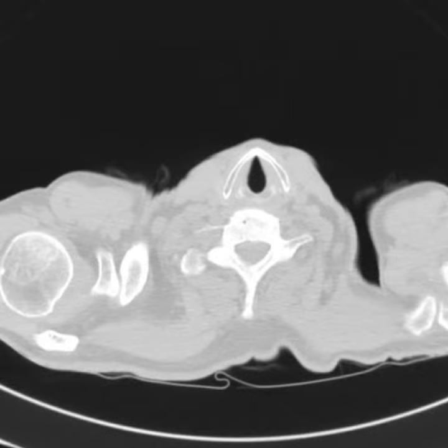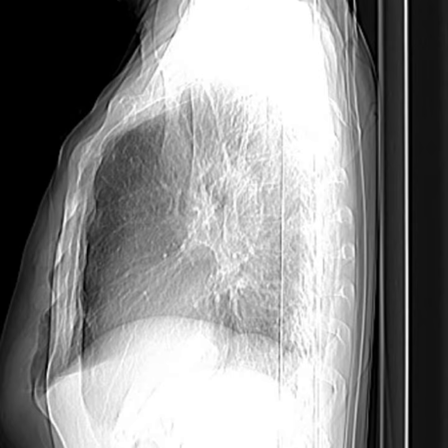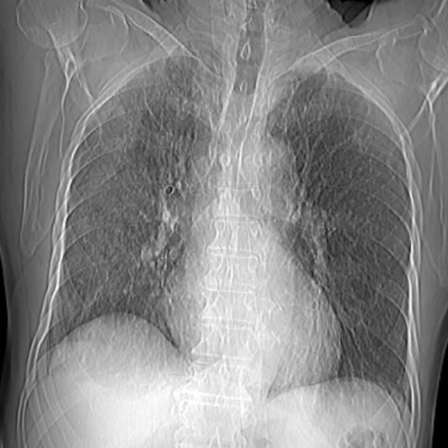So, this is a case of a 50-year-old male patient presented with gradual shortness of breath and coughing. So, chest CT was recommended. First of all, let's see the survey, like a form of a chest x-ray.